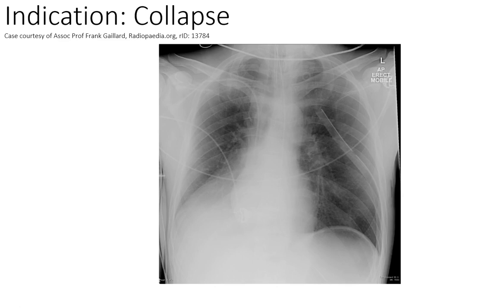The other thing that you'll note is the spinal column is really hard to spot, and you can't see the intervertebral disc. So this suggests that this X-ray is more white, more underexposed than most. The other thing is you see quite a lot of lines here. This patient is a more sick patient. This would be an AP film.